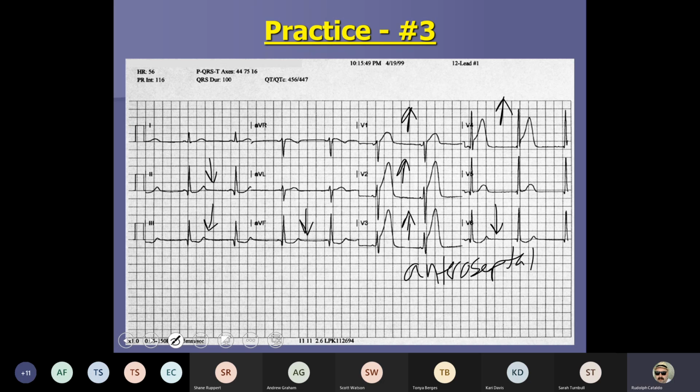Okay, good job. I'm not going to walk you through the treatment because does my treatment change medication-wise versus what I see on this 12 lead? No. I still give aspirin. I still give nitroglycerin. I still give pain meds if they're having it. Treatment doesn't change. It's ACS protocol. We follow it to a T, but we are able to see what's potentially going on so we can have early notification to our receiving hospital that maybe we're bypassing the ED. Maybe we're going straight to the cath lab. Why not? Okay, good job.